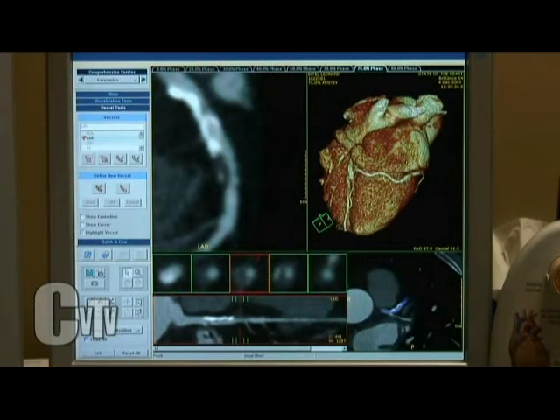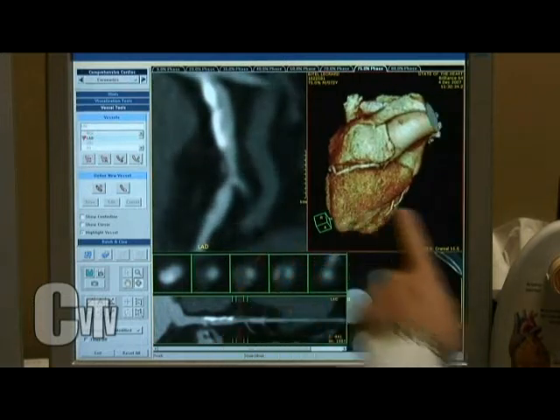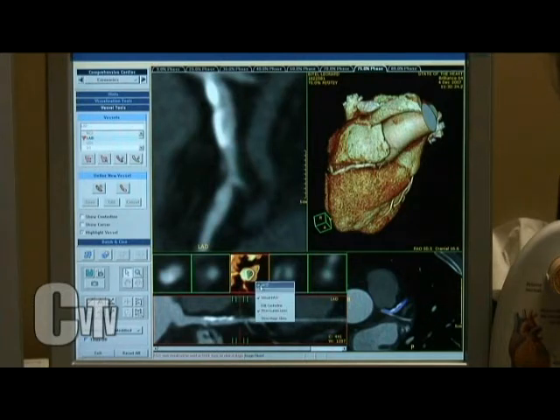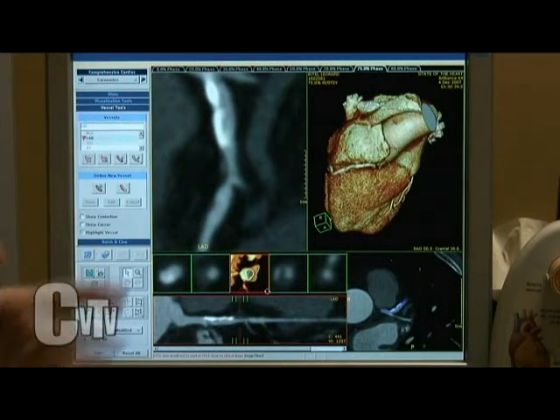So this really gives us an incredible view. You have some way of making this color look that color. How do you do that? No, making this look that color is what I'm trying to say. Oh, we can also turn on this window. We use a tool in the cath lab, an invasive tool, we don't have to do that anymore, called virtual IVUS.